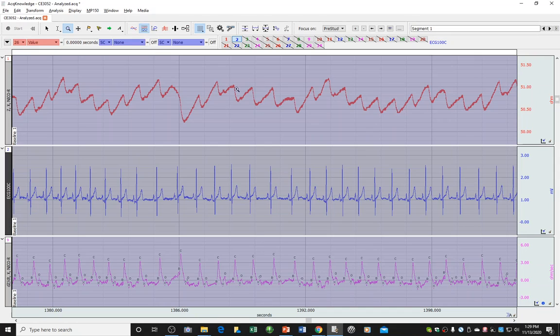So the raw signal comes in, and depending on the software you're using, that might be all you have to work with after you've recorded your data, and you have to extract everything else. Different aspects of the BioPAC software do different degrees of extraction, but I was lucky enough to have BioPAC able to calculate on the fly the derivative of the raw ICG signal. And this was coming in live, in real time, as we collected our data.